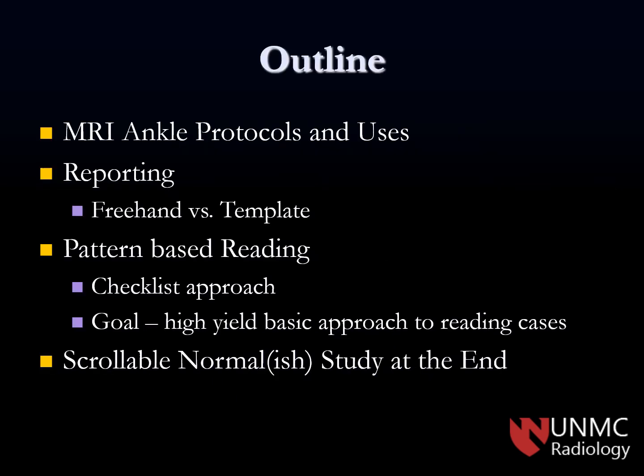The outline is we'll do MRI ankle protocols and uses. We'll talk very quickly about reporting, freehand versus template. We'll do a pattern-based reading approach. Just like all the rest of the joints, I have a pattern-based document on Word that I will give you access to that you can use as a checklist approach to go down each structure and look at each one, so you don't miss anything and have a very uniform approach to how you read MRIs, which I find very helpful, especially when you're beginning.